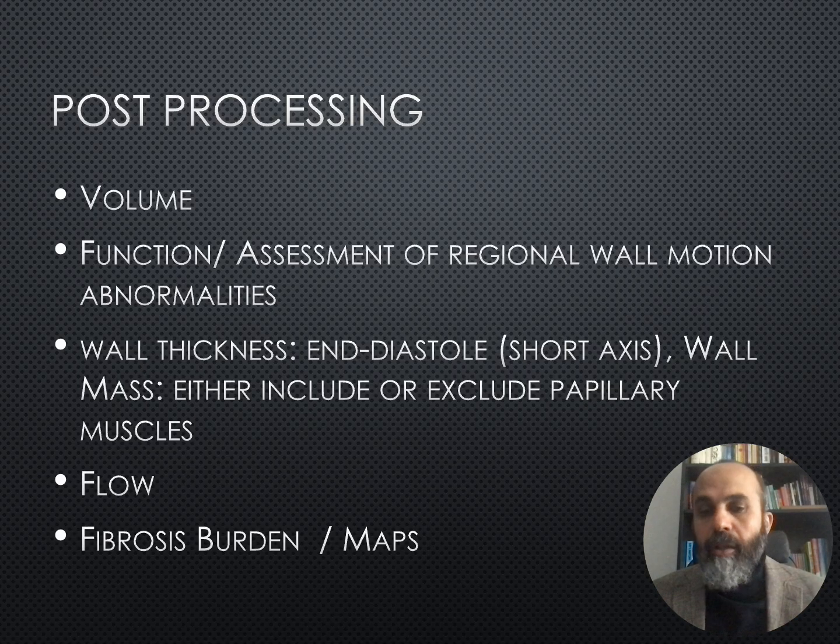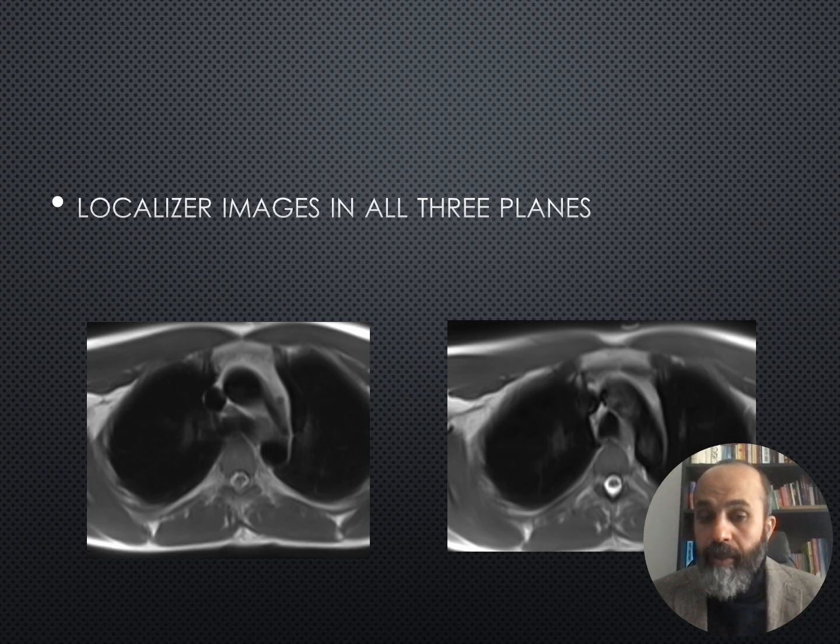Is this regurgitation mild, moderate, or severe? Is this impaired severely, or is it mild? Do this before getting the results from the software.